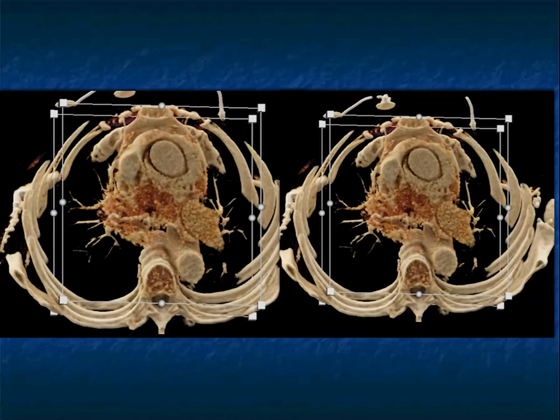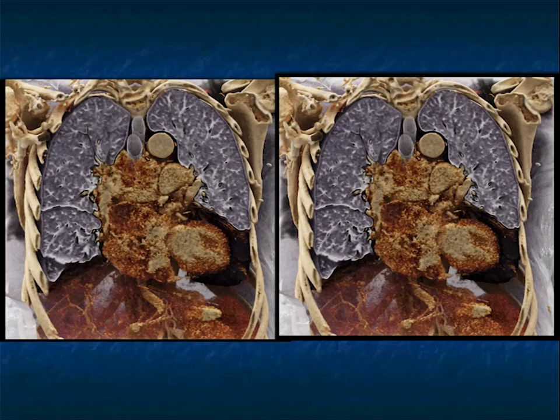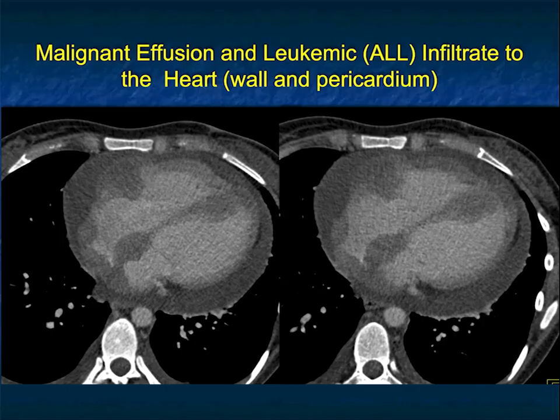So when you see infiltration, remember I spoke about angiosarcomas before, but that's right atrium. When you see it more in the middle of the heart, or on the left side, you've got to be thinking about lymphoma. And this is just a really good example of how infiltrating the tumor is and how challenging it can be.